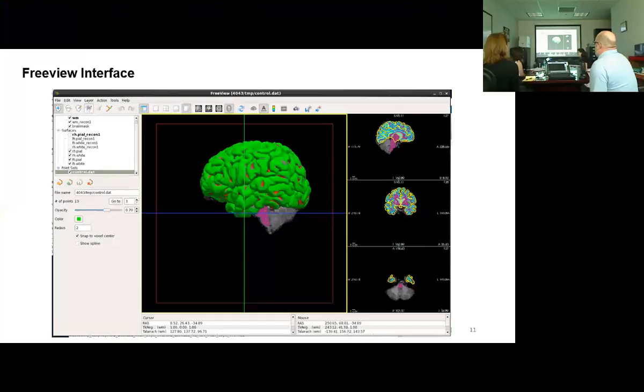Why would you want to load up the originals, like to check your edits again? It's to see how much improvement there's been, and to see if any errors were made. And you wouldn't always want to look at the original recon. Often you want to look at the previous one. So if you're looking at one that already had 4, I'd probably load up the most recent one, recon 4, to see what effect my most recent edits made.